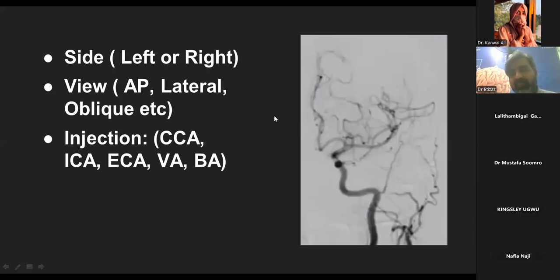Any other person? Sir, it seems like the portions of the internal carotid arteries can be assumed, like cervical, petrous, lacerum, and then the clinoidal ring is also visible, then the bifurcation of the ACA and MCA. So what do you think? It's the ICA? ICA, sir.